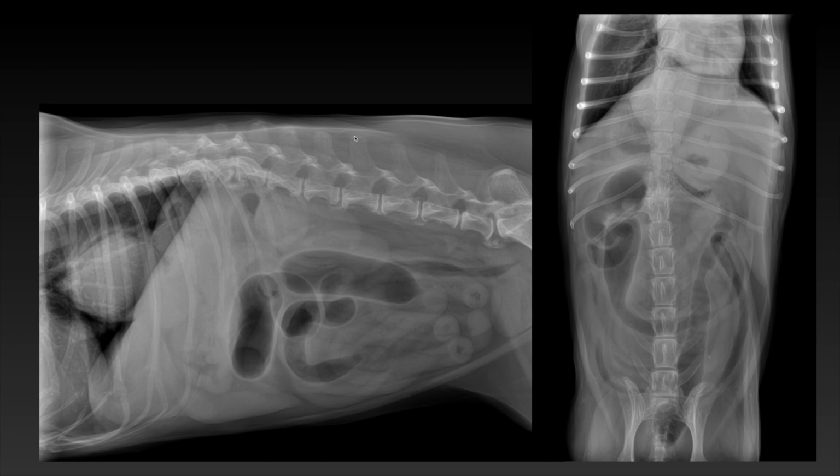Sliding hiatal hernias are often incidental findings in patients with upper airway obstruction and the associated increased negative pressure in the thorax. Due to the breed, a tracheal collapse should be excluded, but hiatal hernias could also be of congenital origin. They do not represent surgical emergencies unless the stomach is incarcerated, which would lead to gas distension and therefore dyspnea and shock. Therefore, the patient should be monitored closely.